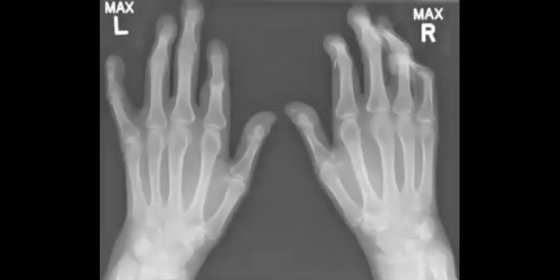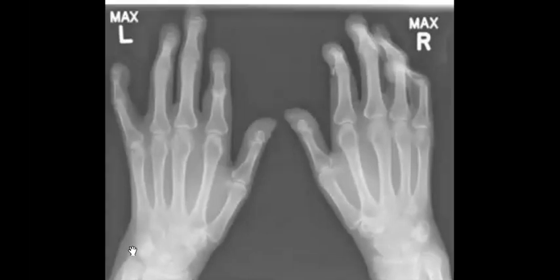So let's have a look at this case and try to find the big title. Erosive osteoarthritis. Maybe if we start with the description it is easier, then you can find it. Yes, Ala, I agree with you. I see also Mansour. Perfect. Welcome, Mansour. New star here. Okay, so acro-osteolysis will be the big title.